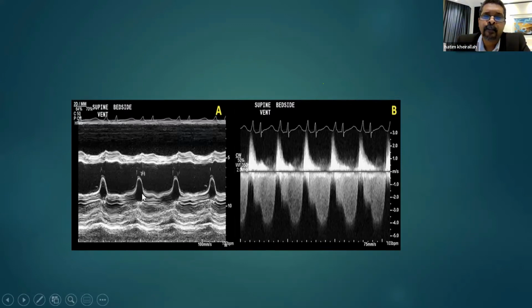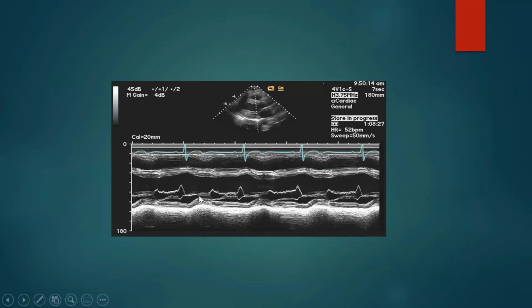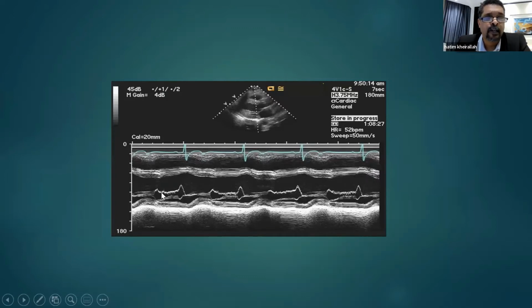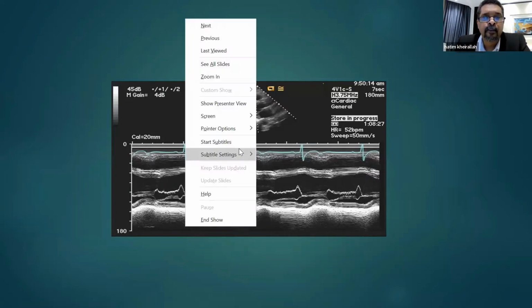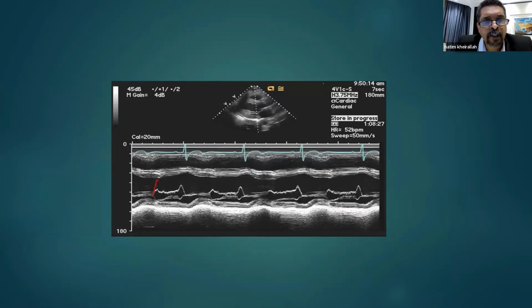And please, when we talk about the premature closure of the mitral valve, let's think of it as this one. And if you look at this one, which is a more common slide, I've seen it a lot. This is the fluttering of the anterior leaflet plus premature closure. So the valve is supposed to open this way. I'm going to show it to you. It's supposed to open that much. And then now it is prematurely closed. It's forced closed before it opens fully.